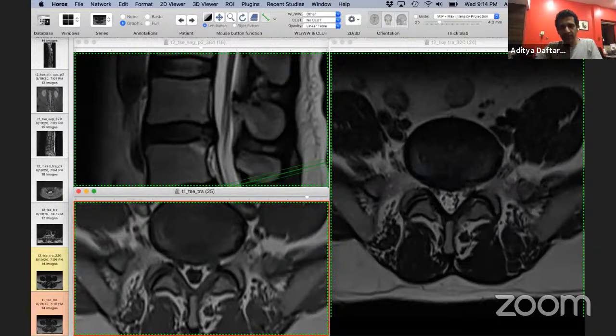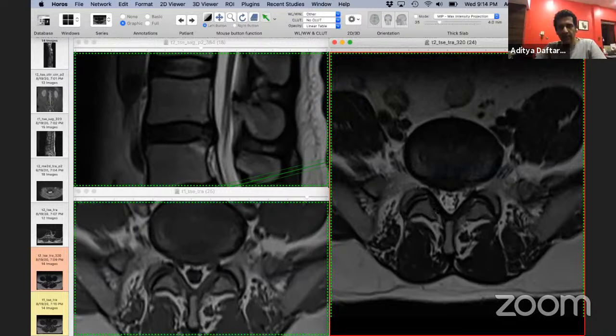And then this over here is your ligamentum flavum. So you can see when there's ligamentum flavum thickening, you want to look for that carefully. And I suppose if you see ligamentum flavum thickening along with some facet arthrosis and facet fluid, then you've got to start thinking about an element of micro instability, which could be an issue for many patients when you see a smaller disc, but the symptoms are disproportionate to that.